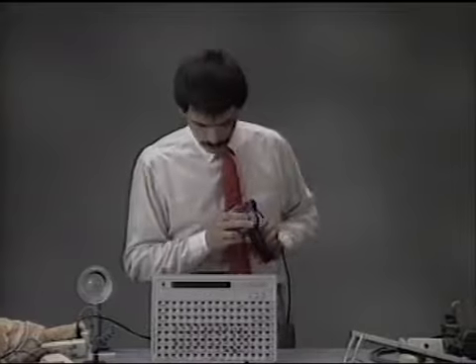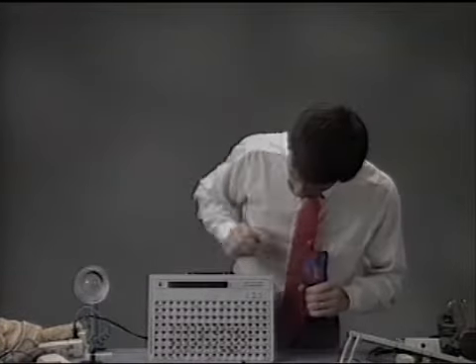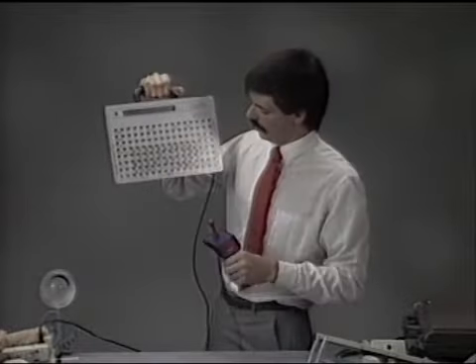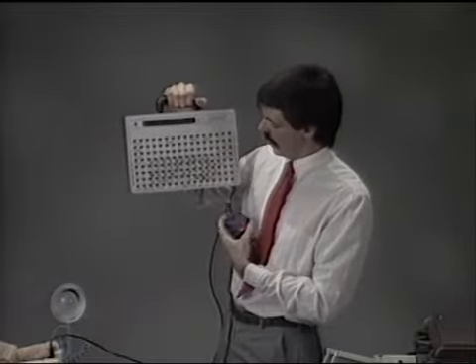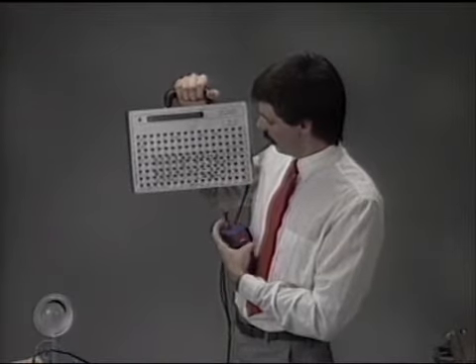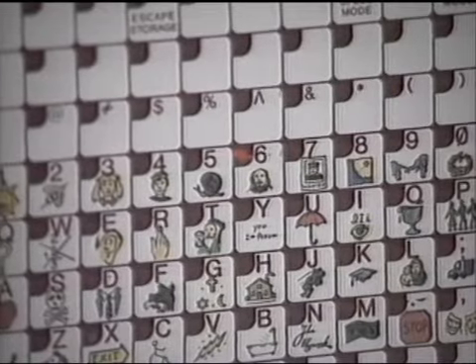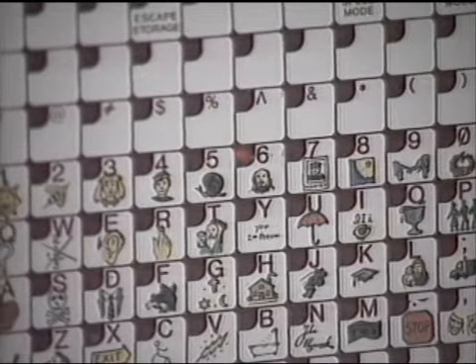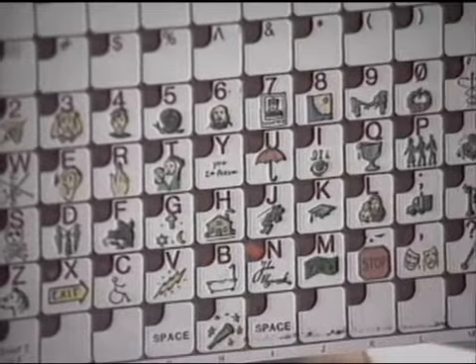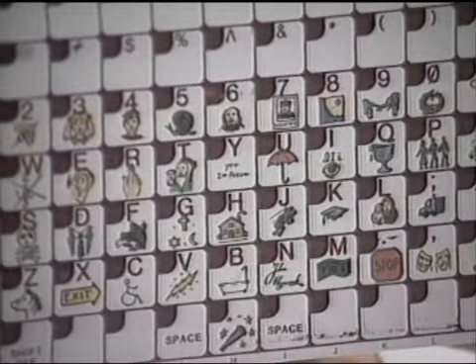For example, if I'd like to tell you my name, I can start off, and if you look right here in the middle, there's a light next to the man, or number 6, and I think of the man as myself. By selecting the man, and then coming on down and selecting the autograph, my name is Richard Dodds.